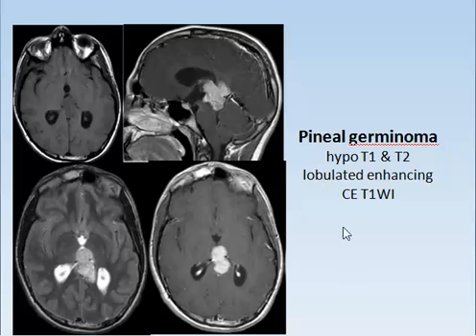So a lobulated enhancing mass at the region where the pineal gland is usually located, identified by its location between the two thalami, is the pineal.